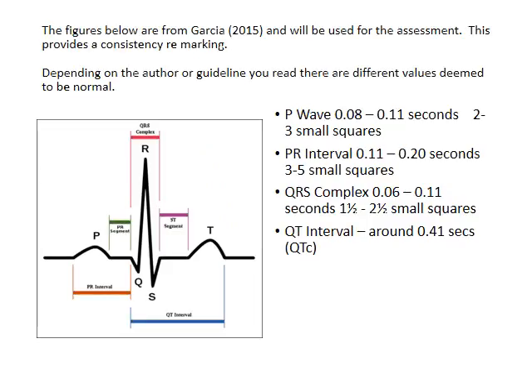We looked in the last session at the basic ECG complex, the P wave being atrial depolarisation, the QRS complex being ventricular depolarisation. Let's be clear about what constitutes a Q, an R and an S. The Q wave is the first downward deflection following the P wave. Not all complexes will have Q waves, and sometimes they're very small. The R wave is the first positive or upwards deflection following a P wave.